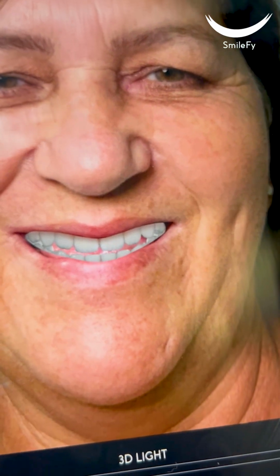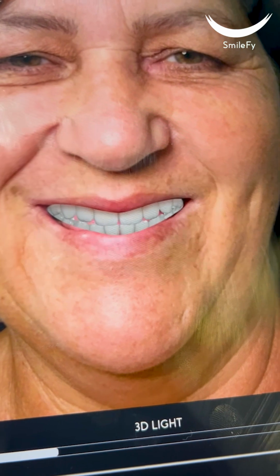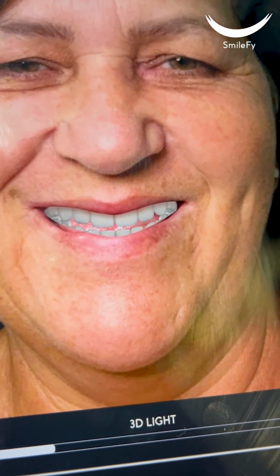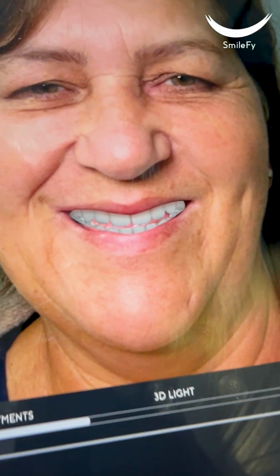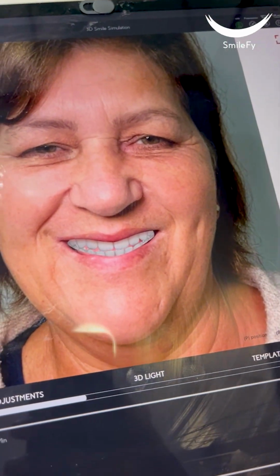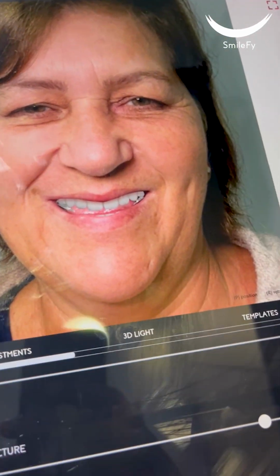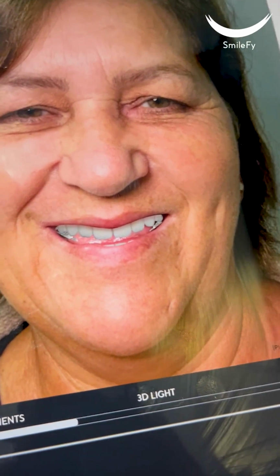Another thing that I really like about this new feature is that you can now also, as you can see, design the lower and the upper, but you can also simulate as if the patient was opening their mouth. That way, you're able to have a more realistic simulation to your first consultation, giving the patient a better understanding and a better experience onto the treatment itself.